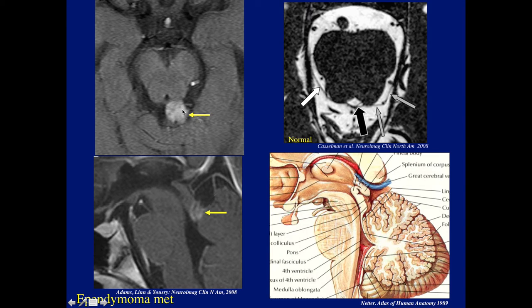This was an ependymoma met. Again, it did not mention in the article if there were symptoms or not, but you can see how there would be symptoms because of this location right next to where the fourth nerve is running. And here it is on the sagittal plane.